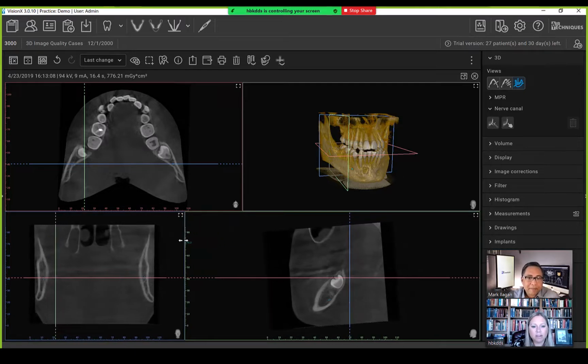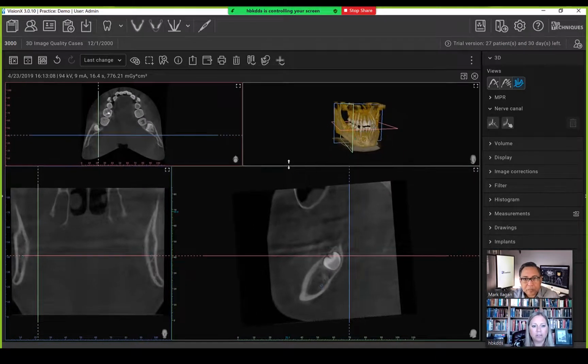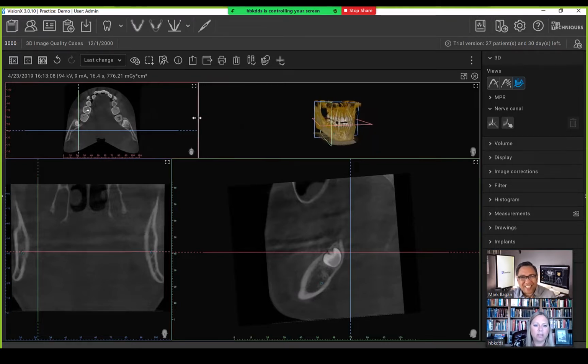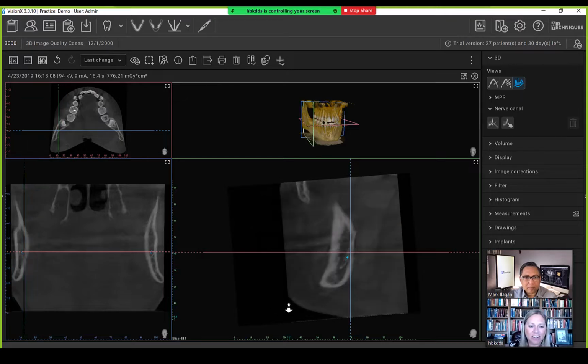This is awesome. Okay, so I did that one. Can I drag up here? Yeah, yes you can. Oh, so okay. Okay, I'm gonna have to try to make myself symmetrical here. OCD kicked in. Yeah, I could see that. All right. Yeah. All right. So that's really cool, because then you can enlarge this. You can be reviewing it while you're, you can see exactly where you're at.